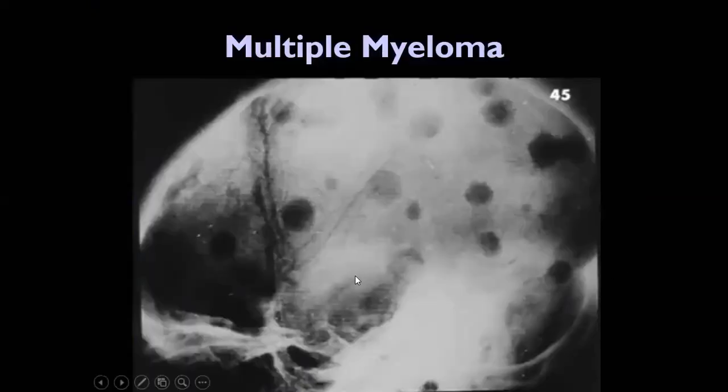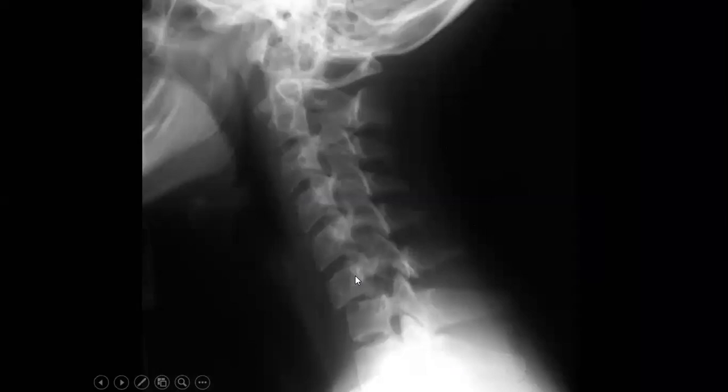And here, many appearances of multiple myeloma. So go further, and I think we mentioned this case before, but yeah, checklist. One of the important checklist items is to check the predental space, and check all these spaces and alignment and the lines, the anterior line, and go with the ABC.